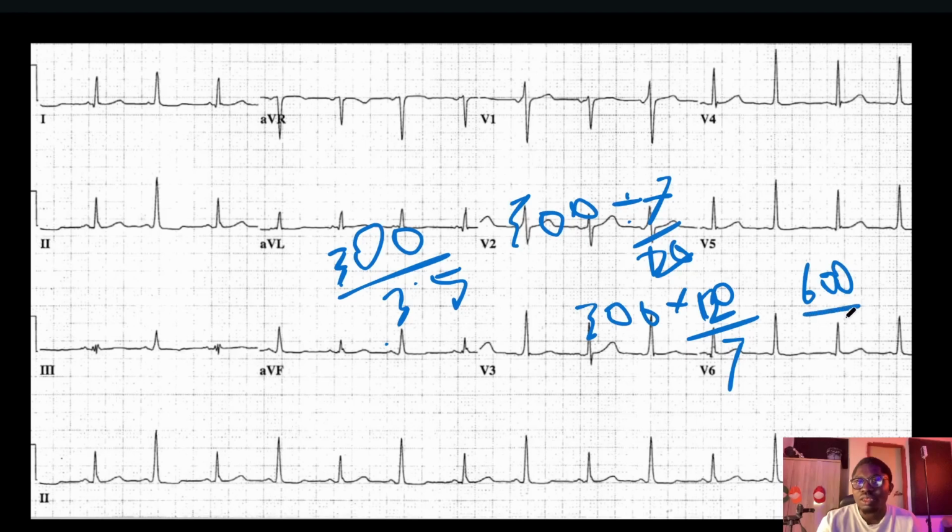I'm using the long method. I don't have a calculator on me.